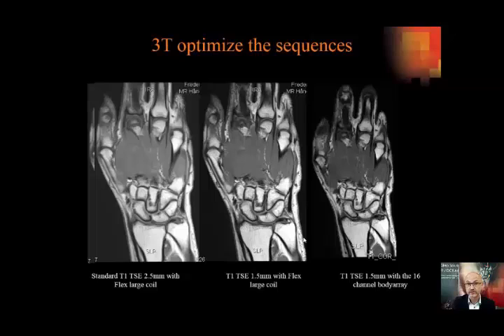When we talk about erosive disease, it's also very important that you try to optimize the MRI sequences you have, because erosions in complex joints like the wrist are very difficult to see. You have a lot of curvatures in the bones that can easily be interpreted as an erosion, but could be due to an anatomical anomaly or the insertion of a ligament. So you have to optimize the sequence to have a low slice thickness and a very high matrix. If you do that, you can achieve good quality in even less scan time than the conventional MRIs that the vendors provided us with.